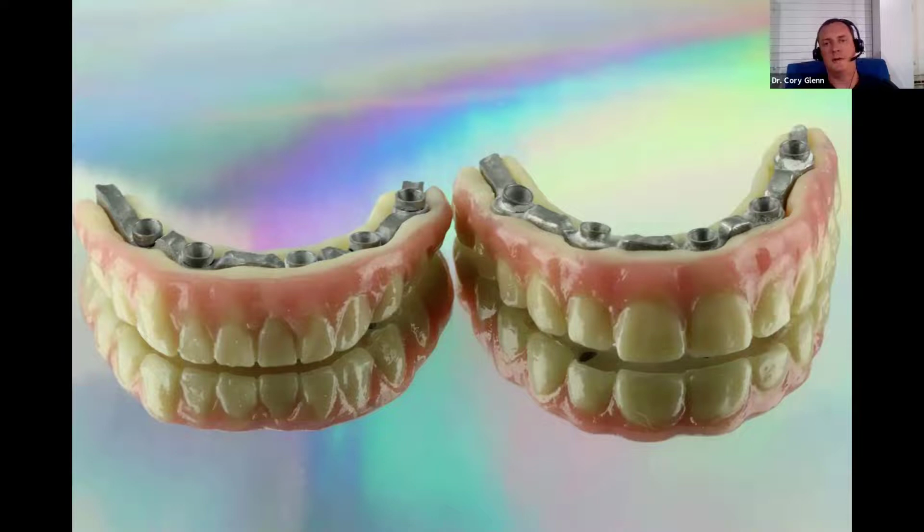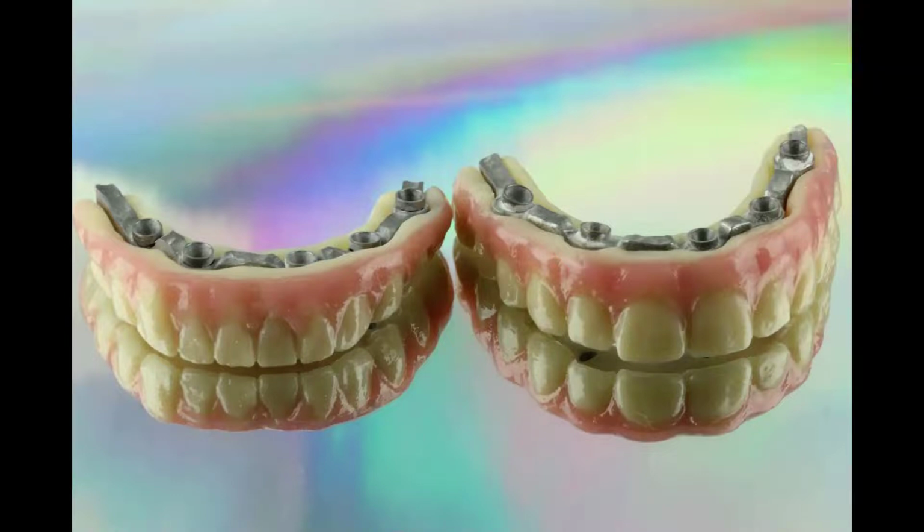But it's purely a matter of just right-clicking the implant. And I should say this only works with Blue Sky implants, because obviously we have the shapes and the files for all of our abutments. But for example, if you're using Straumann, we're not going to have their prosthetics in there. They have to provide those to us, and no company has done that. So this would only be for Blue Sky implants or lines that we're compatible with, but you just swap in the tie base and now you see where its margin is, or whatever abutment, and you can plan your crown and everything accordingly.